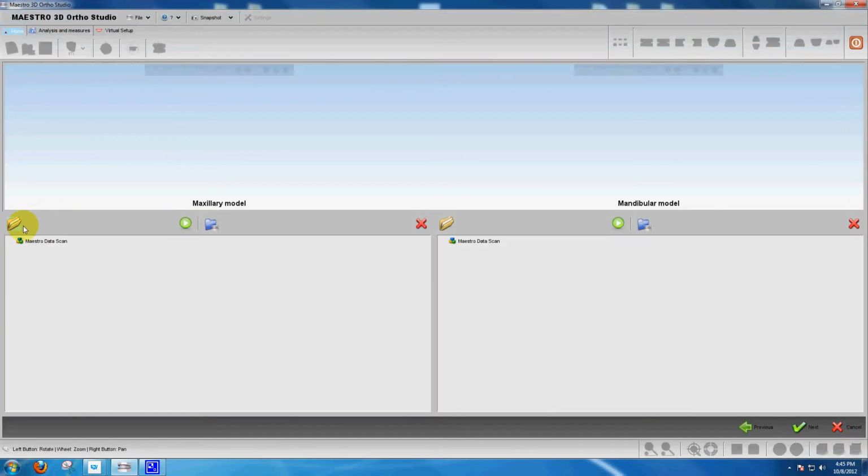So I guess if I were to rename this file or this icon, it probably should be renamed. Here you look for .stl files. And this, while called import, should probably be renamed. Here you look for the .ortho files.